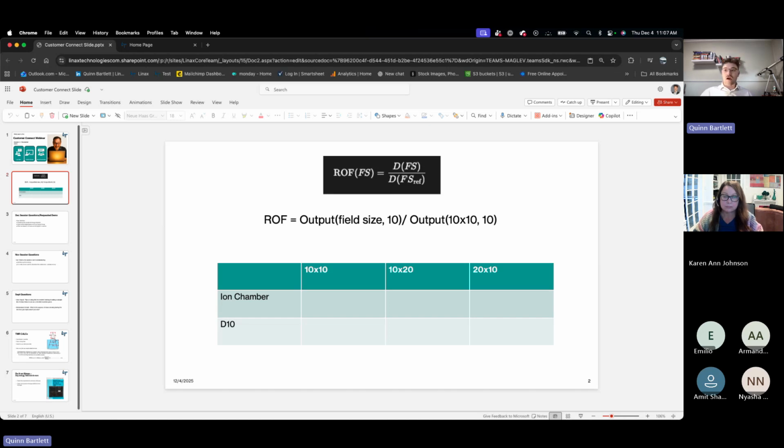So now on Simac, we allow you to show this simply, run multiple beams in minutes, change your jaws instantly, and we can also go to the extreme, never-seen-in-the-clinic scenarios that highlight the theory more dramatically without breaking a real machine. It really allows our students to get their hands on it and understand these phenomena, why we're doing these things, and how understanding them more is going to make a more effective team. Okay, so that's my spiel on why they're important.